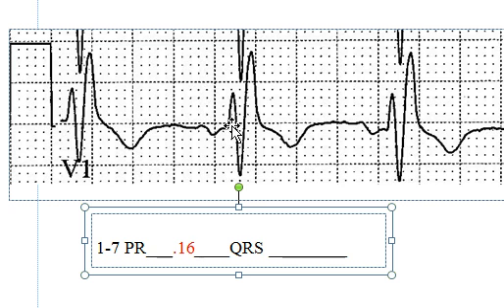QRS includes all of this here. So the QRS begins, let's see, we have the P wave, it went up, it went down, and then there's a little straight line here. And then it very sharply veers from the line and goes straight up. That is our R wave. So you'll start measuring then. It drops down, drops below the baseline. So that's what we call an S wave, as it follows the R wave. And then it jumps back up again for a second R wave.